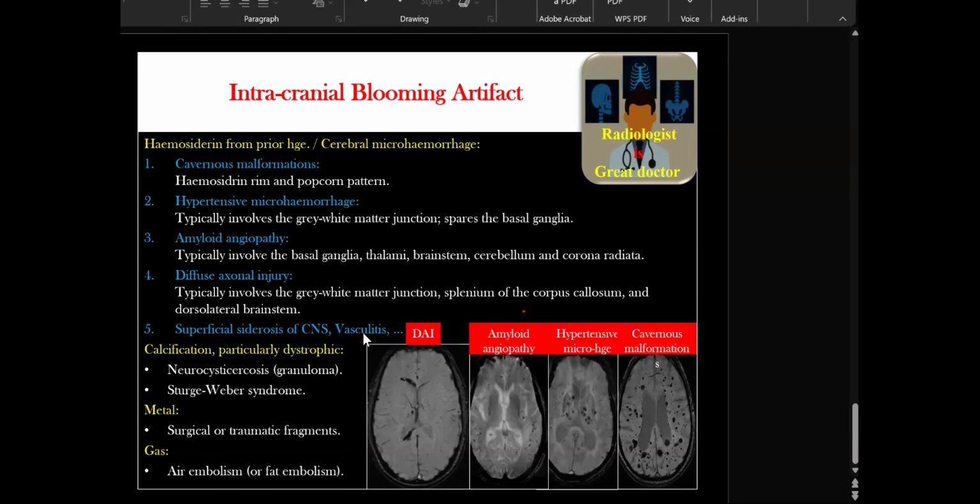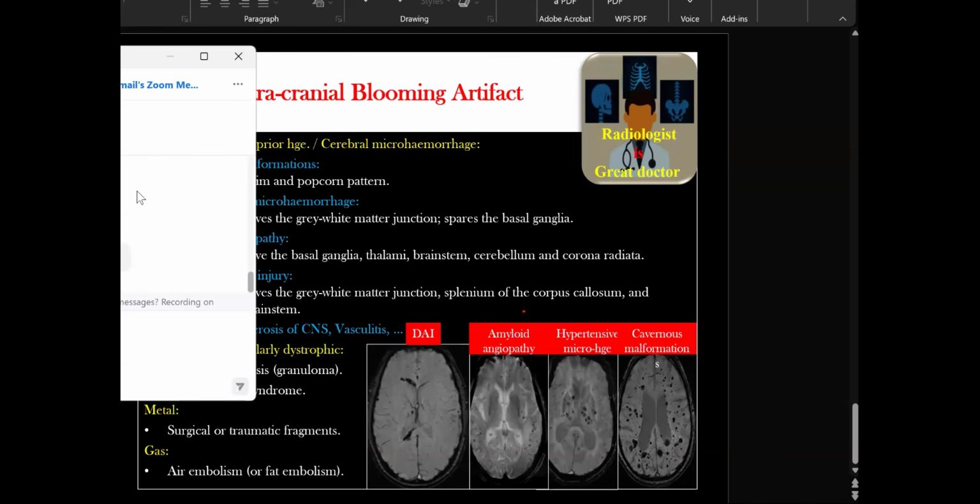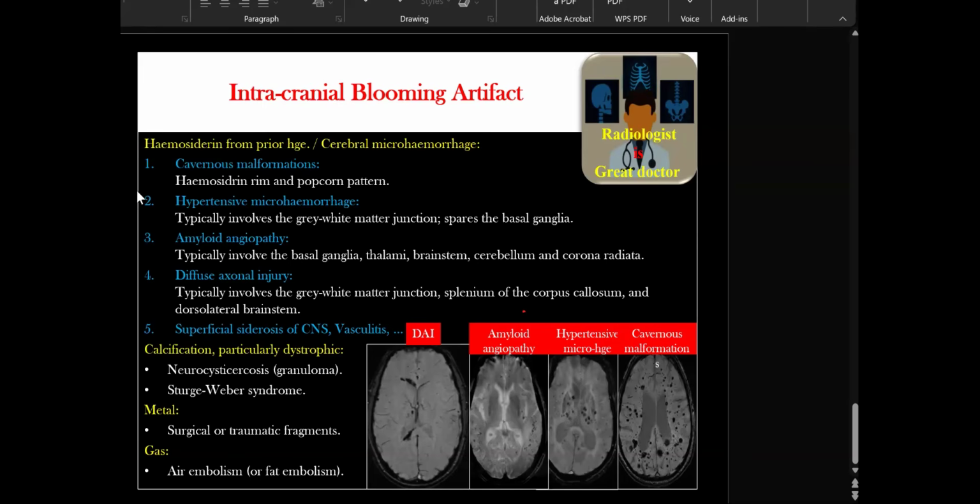Okay, my friends, it's important if you face a case of diffuse axonal injury in the exam and you suspect it, say the pertinent negative: I see some foci at the gray-white matter interface, but no hyperdense foci at the area of the corpus callosum. And remember, in the corpus callosum the bleeding can be at the genu, at the splenium, or higher up at the body, in the center of the image. Any one of these, of course, later on can cause superficial siderosis.